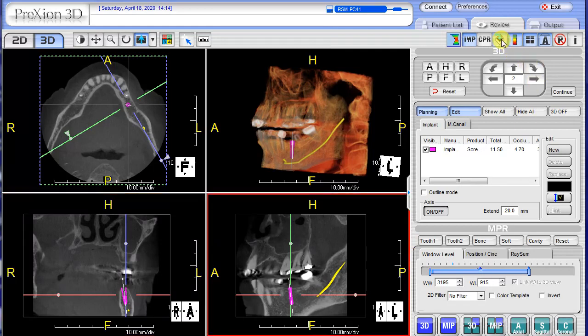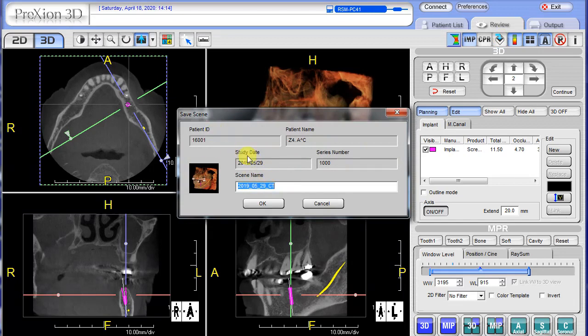So I prefer to hit this little blue arrow on this book icon, and then you don't need the patient's name or date. You don't even need to save the name if you don't want to. If you are saving the name, just simply type over the blue.